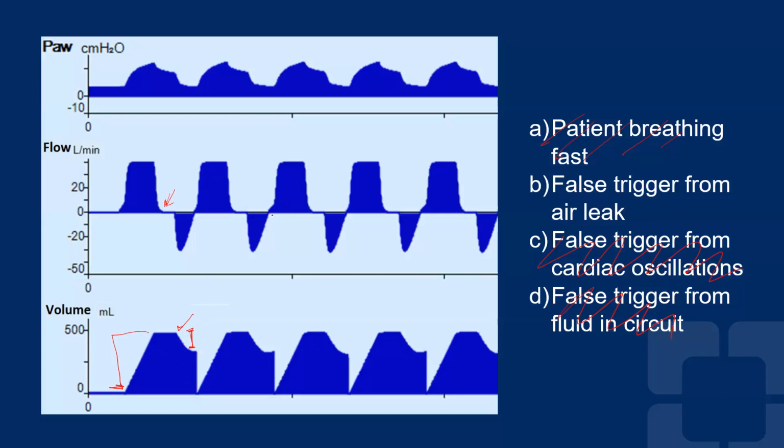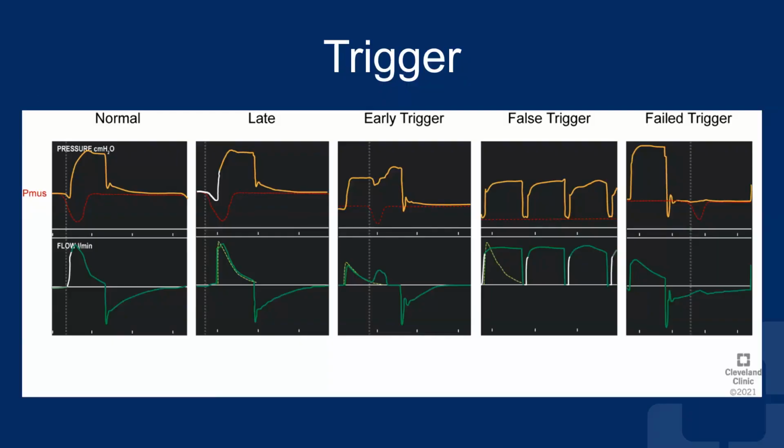And we also see evidence of PMUS. I mean, instead of decaying like this, the patient is actively breathing in. This is exhalation, very active. And then it shifts to inspiration. And this is a pressure control breath. And you can see that it's controlled throughout the breath. And then the breath ends and triggers again, and the pressure is going below baseline. You see how it drops below baseline. So this is highly suspicious for the patient doing effort.